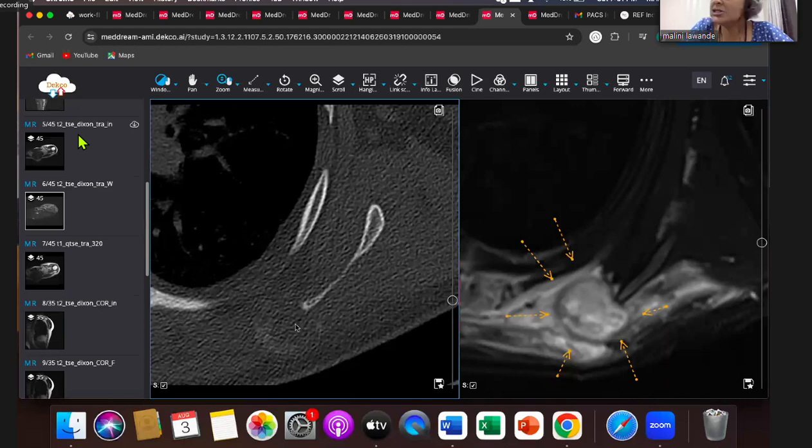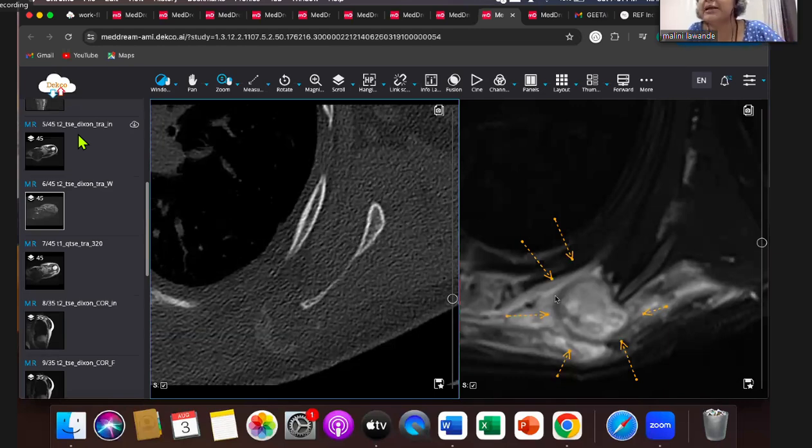Cystic tuberculosis, no, because I'm seeing calcification and this disproportionate edema. The clue is the disproportionate edema. Heterotopic ossification, so that is what myositis ossificans is, the etiology is not known. Maybe there was trauma, maybe there was no trauma. It's essentially ossification happening there. So tuberculosis, no, because the edema will not be so disproportionate and this is solid. If you look at it, it is solid.